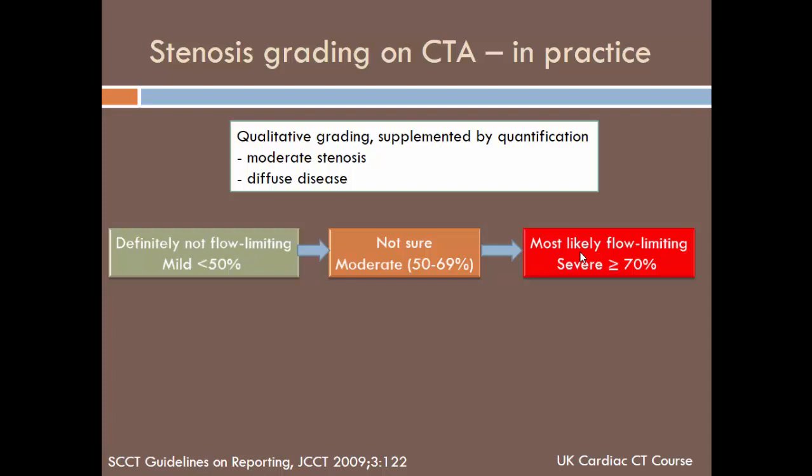When I'm not sure, so the middle category, then I would call that moderate. And then just to substantiate my visual estimation, I will use quantification in such cases, using either diameter or area tools on the software. Otherwise, I would just visually say mild or severe.